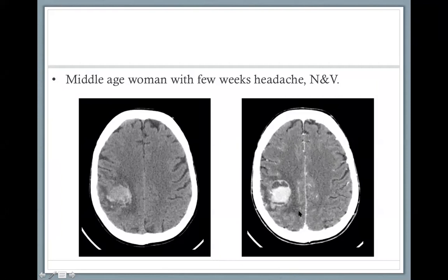If we bring you an image, most likely it will be annotated. But if it is very obvious, there might be a good chance that you will be asked what kind of image it is or what the difference is. In general, we might give you the annotation, but you need to be able to pick up things like, for example, that this image is with contrast.